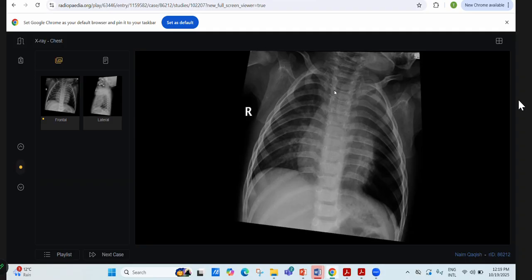Number two, you should be confident in saying that in children, because in any other case I did not give you history, only in this case, because in such cases history is very important. The words I said, a sudden onset of cough, and right away you reach the diagnosis of foreign body aspiration. So you should be confident in saying that I will pick up the phone and call the referring physician or the pediatric team in the emergency department and refer him for bronchoscopy.